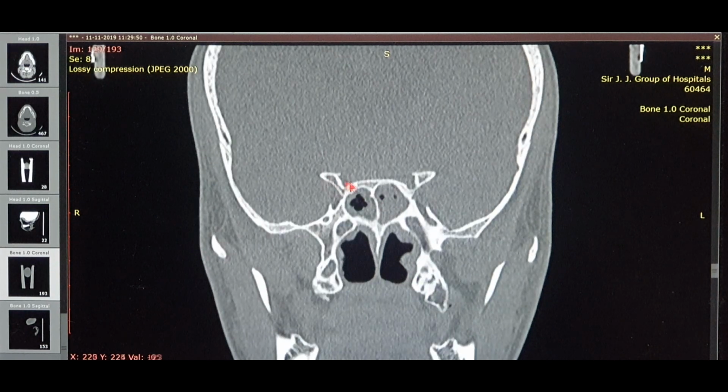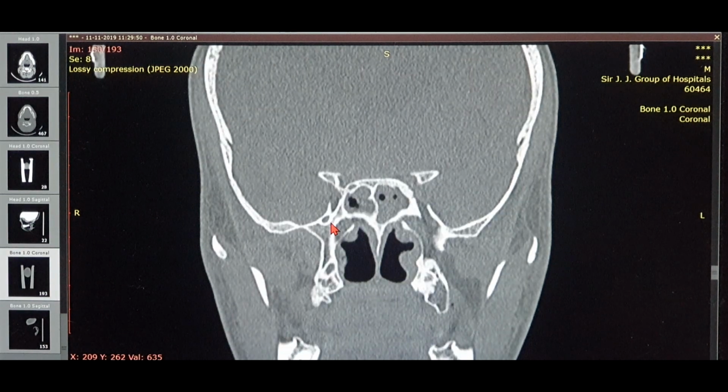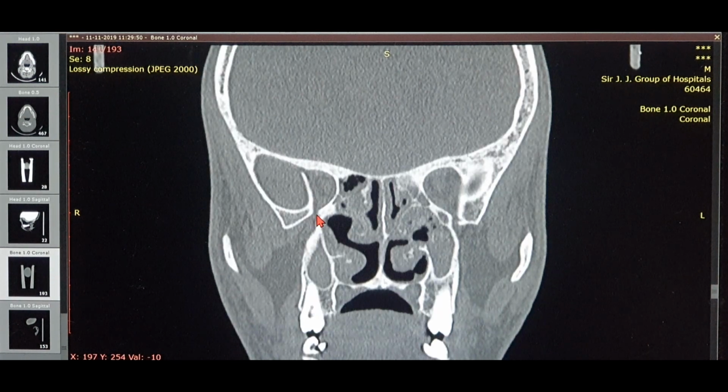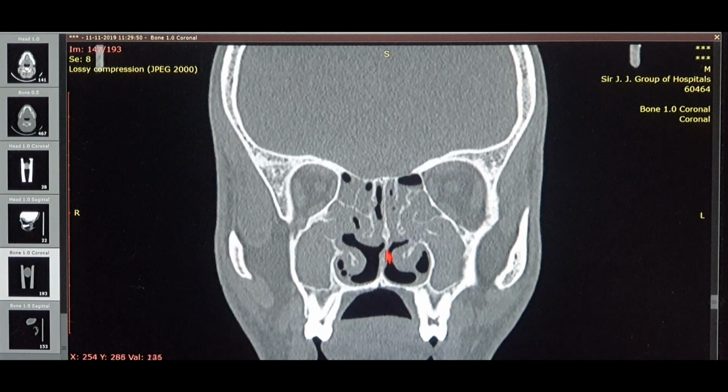Now what you see like this is the anterior clinoid process. Now this is the anterior clinoid process, that's the sphenoid. And where the rostrum of sphenoid was is right exactly before the origin of the sphenoid. So as you can see over here, if a question is asked about the rostrum of sphenoid, you've got to follow the nasal septum, the bony septum. You can see this is a bony septum, which is very thinned out.